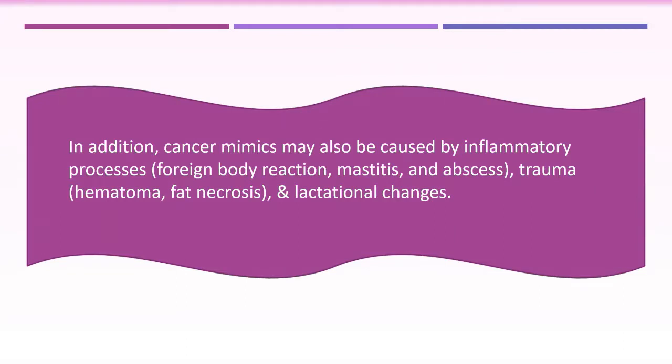You haven't seen suture calcifications? Suture calcifications, and sometimes even sewing needles, or any foreign body, can be introduced into the breast, traumatic, you see, and give some reactions. These reactions can be suspicious, simulating cancer.